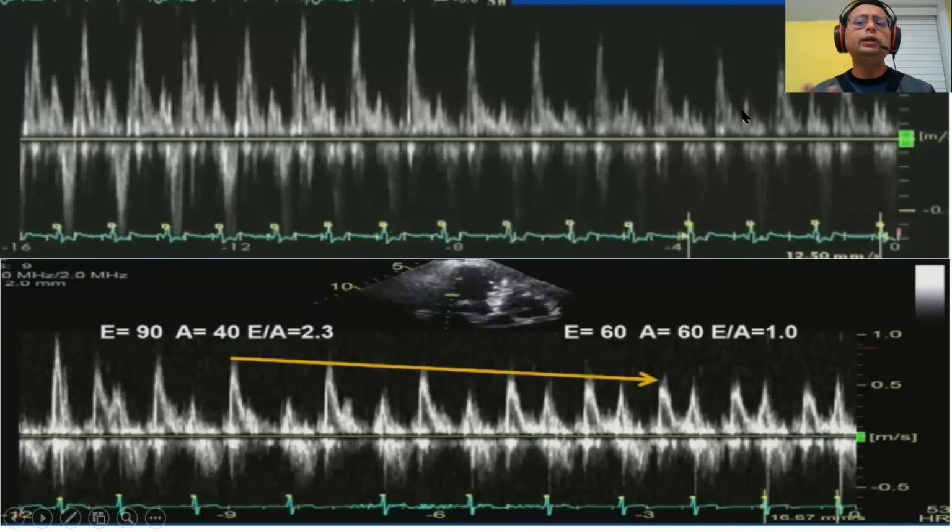Okay, so you know that this patient has normal diastolic function and normal LA pressure. This is just a young, fit athlete. Okay, what about the bottom one here? On first glance, the E over A is as high as the E over A for the top here.